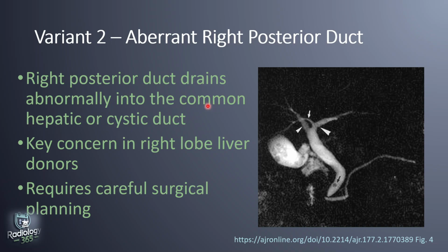So in this image of a 45-year-old woman with symptoms of extrahepatic cholestasis, this MR cholangiogram shows, besides the stone in the common bile duct, we also see drainage of the right posterior hepatic duct. Remember, ideally it should drain into the medial part of the right hepatic duct. However, this time it goes all the way to drain into the left hepatic duct before joining the right hepatic duct. So this is an aberrant insertion. Sometimes it may insert anywhere. It may go and insert in the common hepatic duct or somewhere else.